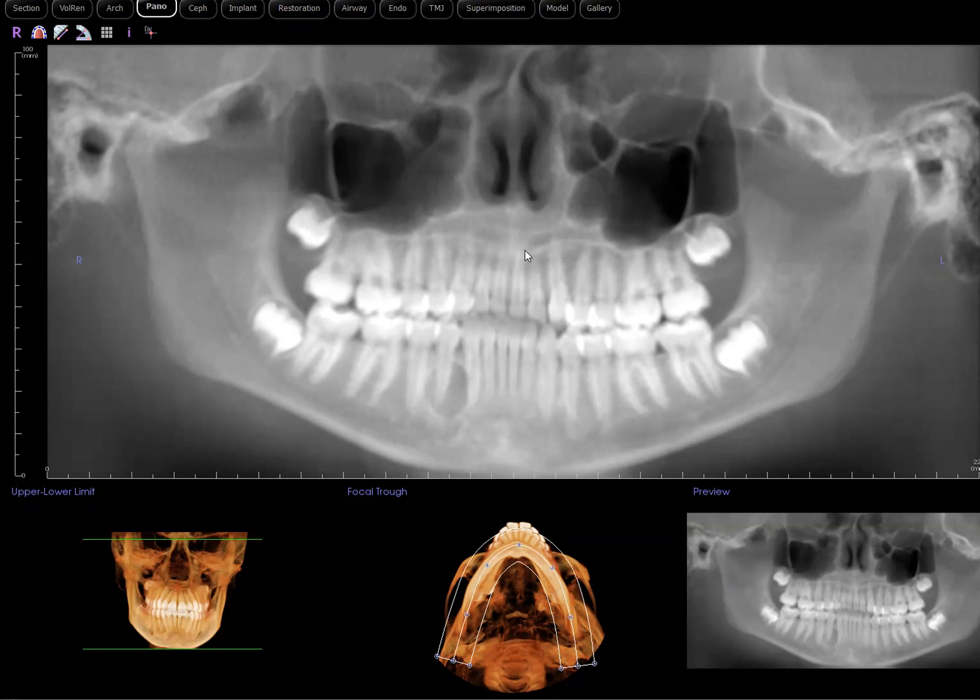All right, so today is yet another very interesting case that I'm very proud to share with you. This is a female patient in her teens, so teenage girls. What we have here is a reconstructed panoramic radiograph showing a very well corticated radiolucency in the area of tooth number 27, 28, 29. And it extends from the cervical third of the root inferiorly to just below the apex of tooth number 28.